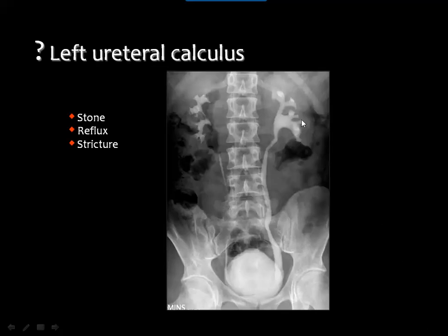And sometimes you are confronted by this after doing an intravenous urography, and you see one kidney is good, the ureter is of normal caliber. In the opposite kidney, you see distension of the pelvicalyceal system and the distension of the whole course of the ureter. Usually, the ureteric course is displayed as segments because of the peristalsis.